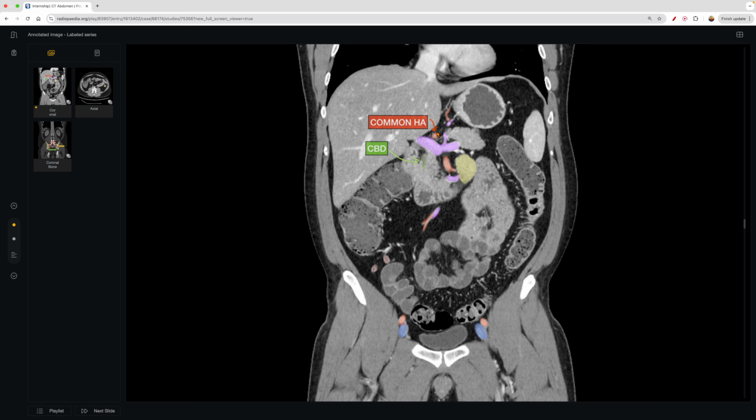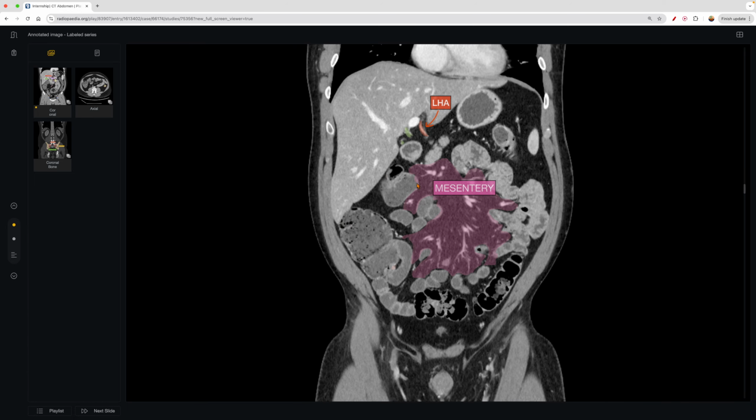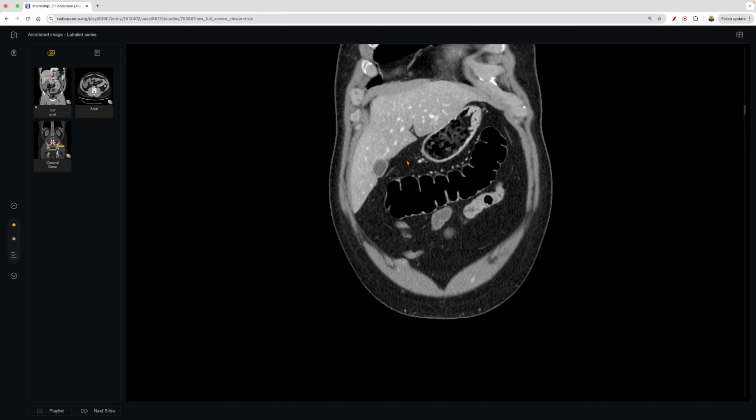And for medical students, of course, it's just nice to be able to identify the structures. Of course, know the type of window that you're looking at, know the type of slice that you're looking at in terms of the view, if it's a coronal, axial, sagittal. And then if you can pinpoint some of the other structures, that's great. And mostly what you're looking for is just knowing the normal anatomy. That's most important. And so let's focus back on the liver again.